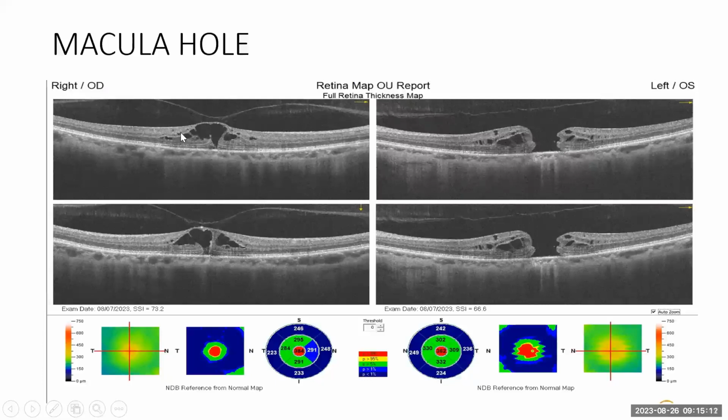Now, to the right eye. The macular hole is a retinal break at the macula, and it's usually full thickness. If you look closely, you would see that although there is a cover upwards here, the biomarkers, the lines of the outer retina, have been distorted in this eye.